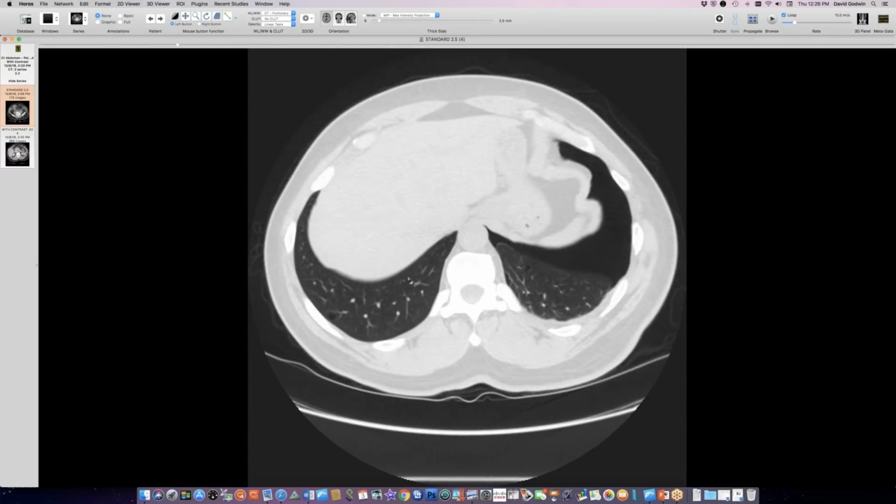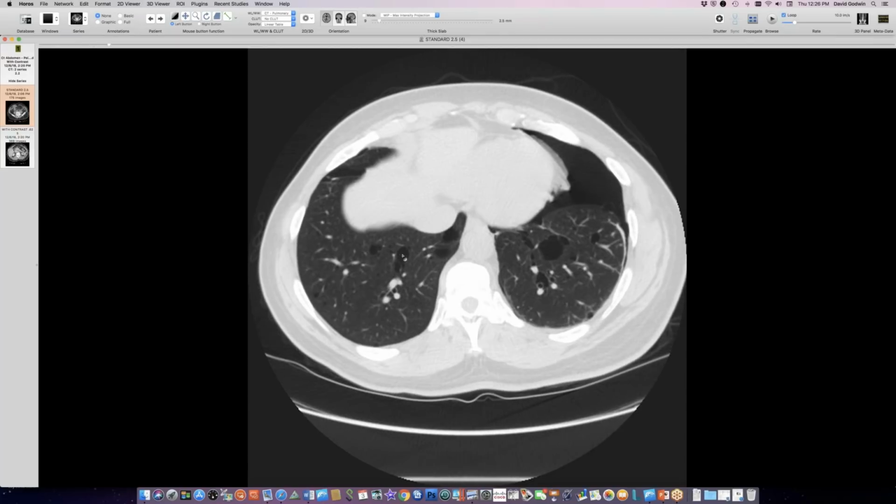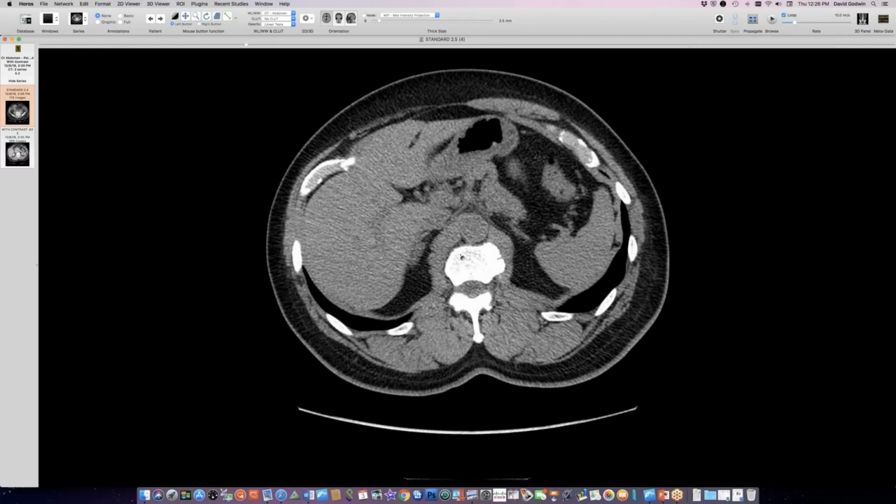And so we had this abdominal CT, and it wasn't shown to a radiologist because it was an outside exam, and so people didn't pick up on the fact that this is really a cystic abnormality. It's not emphysema. And so with the, let me show you his renal tumor as well.